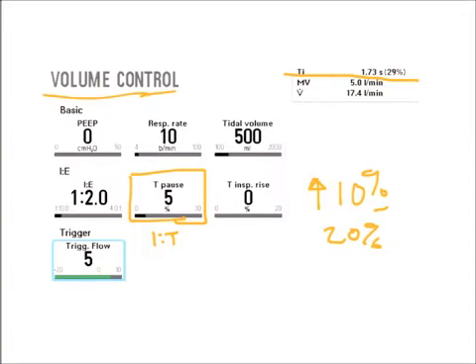Now this pause setting is not really to measure plateau, it is, but it is mostly used when people were scared of using PEEP, and they'd use this to create an exposure time and more of a mean airway pressure for lung recruitment and alveolar filling time. So I don't want to keep my setting at 10 to 20%. I just want to do this during the maneuver to get my measured plateau value, because this could be very uncomfortable for a patient who's spontaneously breathing or is active spontaneously, because it could lock them out from exhaling.